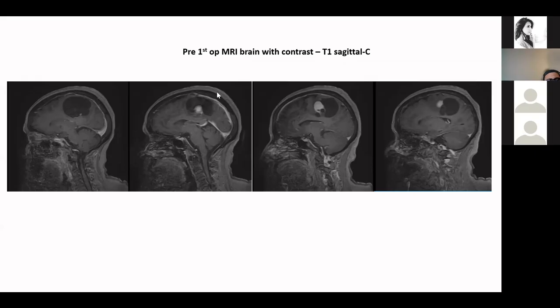So it does not appear to be a meningioma because it has heterogeneous characteristics. The age group is 65, so I was just considering hemangiopericytoma in this case because it has inhomogeneous texture. All right, that's all, thank you.